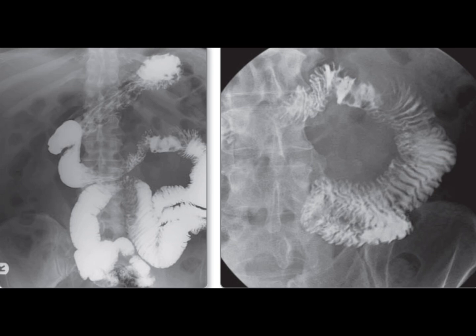Today, I'm examining a pair of images from a barium follow-through examination, focusing on the small bowel. These images reveal an apparent solitary focal abnormality at the duodenojejunal flexure. The mucosal fold pattern is obliterated over a short segment of 3 or 4 centimeters and is replaced by a relatively featureless, smooth pattern. I notice a suggestion of nodularity inferiorly, which could potentially be food debris.